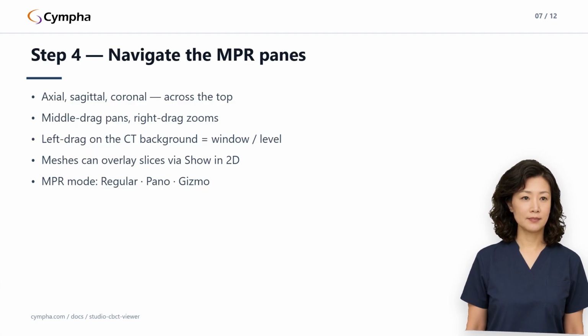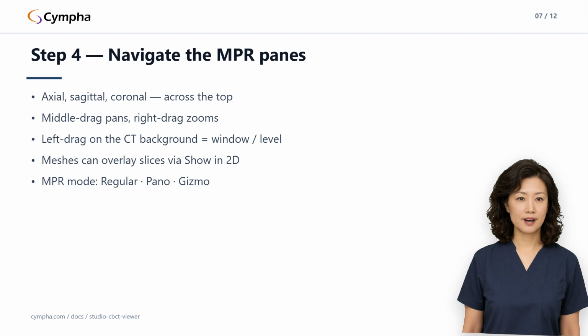Here's a small toolbar that many people never notice. When you've loaded a CBCT without a plan layered on top, a compact toolbar appears at the top center of the viewport with 3 quick framing buttons: front, patient right, and patient left. Remember that patient right appears on your left as the viewer. The buttons are named from the patient's perspective, the way clinical convention wants it. Each one reframes the main view orthographically, which is exactly what you want for cephalometric style profile and frontal views when there's no ortho plan loaded.